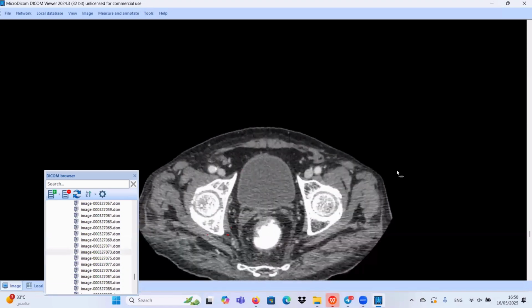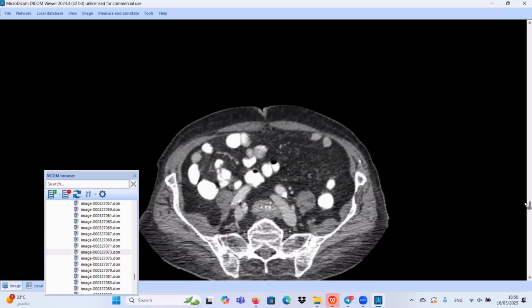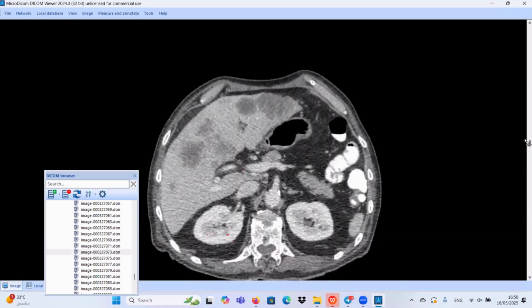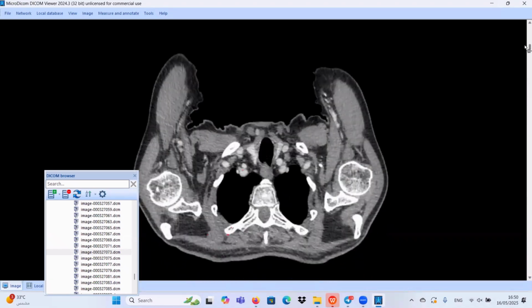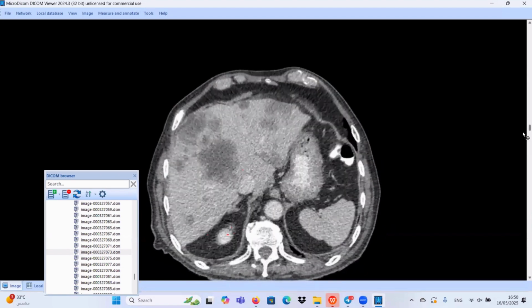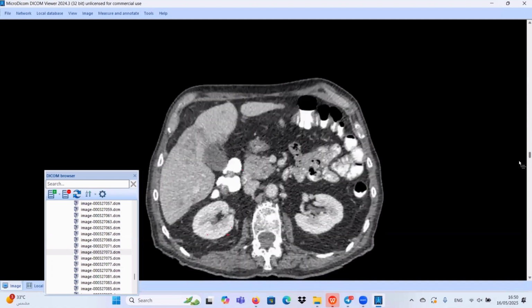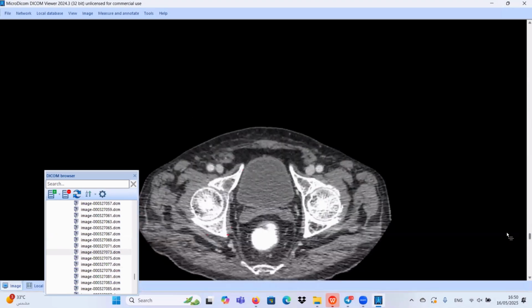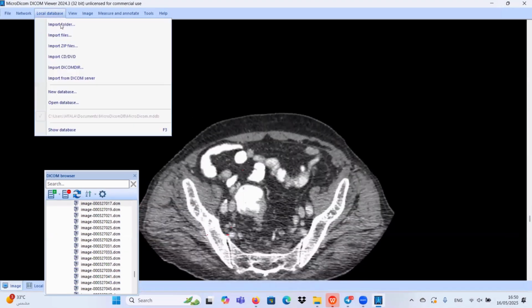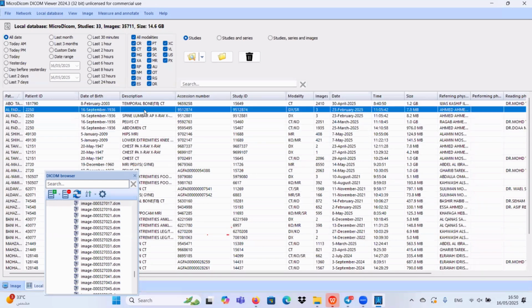So the logical thinking here is that we have colonic adenocarcinoma with osseous deposits, hepatic deposits, pulmonary deposits, and we have also, I think, bilateral mild pleural effusion. Yes. So for this case, let's review the X-ray, maybe retrospectively, maybe you find something. Okay.